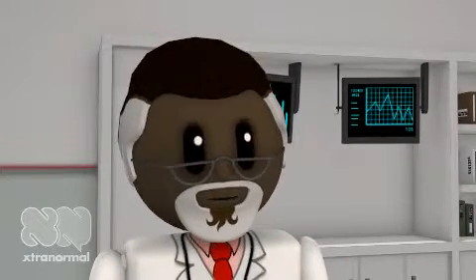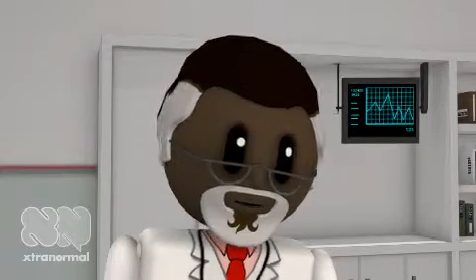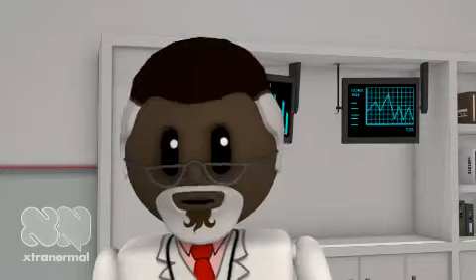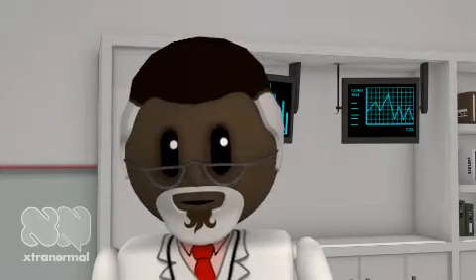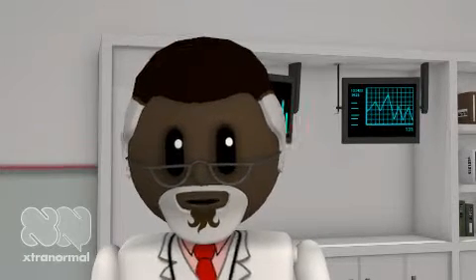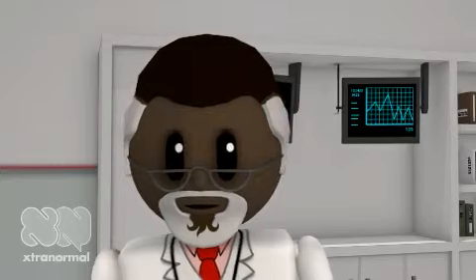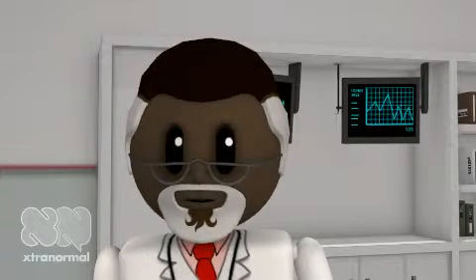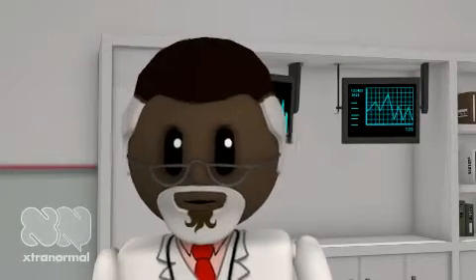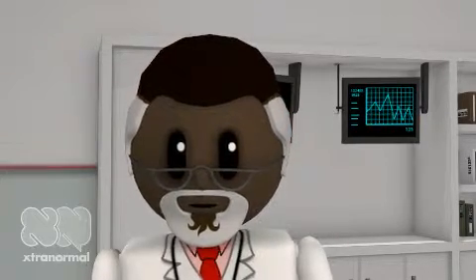Volume targeted SIMV: spontaneous breaths interposed between mechanical breaths. Flow time graphics demonstrate mechanical breaths delivered at a constant flow rate while spontaneous breaths are by lower, non-constant flows. Pressure time scalar demonstrates spontaneous breaths and mechanical breaths. Volume time tracing displays smaller volumes delivered during the spontaneous component of the SIMV cycle.